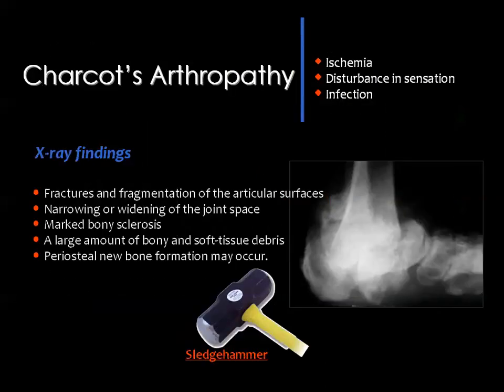neuro-osteoarthropathy. Then, if you look by the plain X-ray, the affected joint will appear as if it has been hit by a very strong hammer.